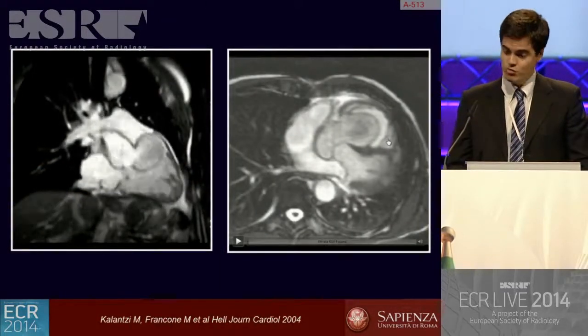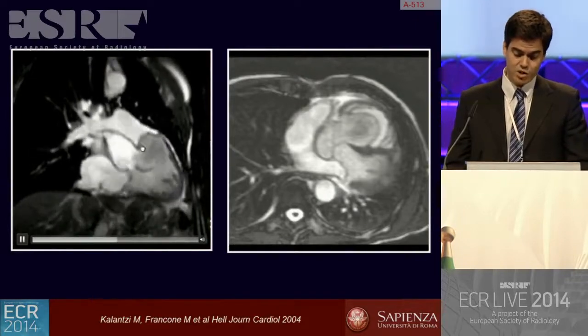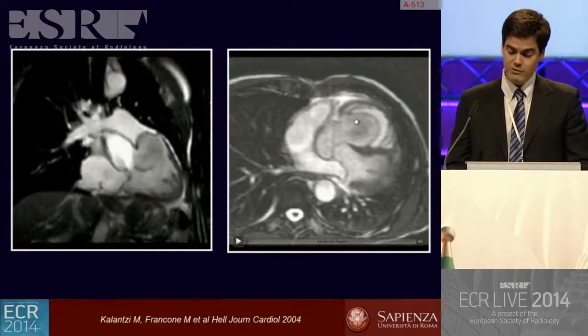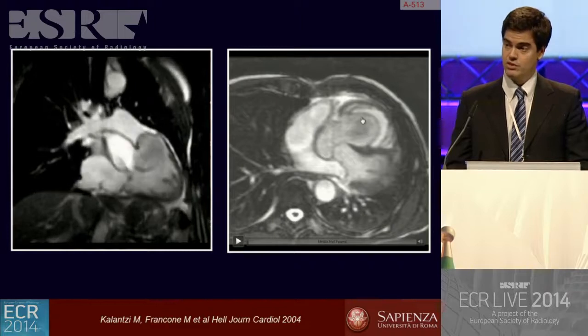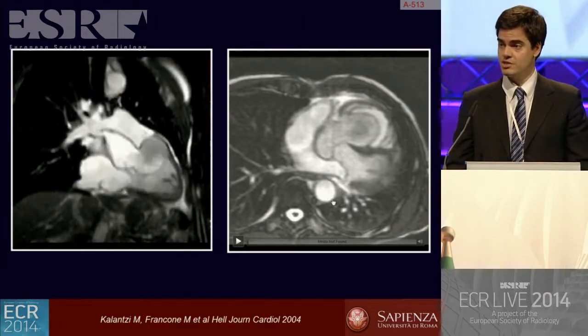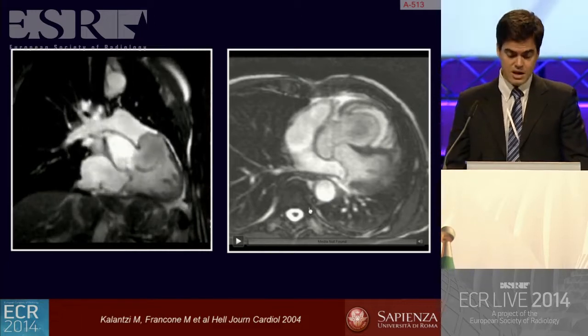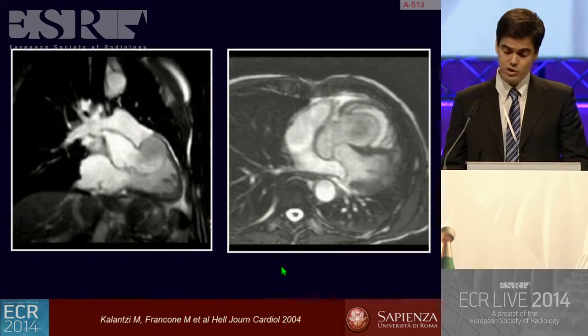And the first movie is not working here, but it's clearly already that you have a lesion which is communicating with the lumen of the aorta, and it is an aneurysmatic Valsalva sinus which is protruding within the lumen of the vessel. This is a typical case of a pseudomass which was clearly interpreted as a tumor, but I will show you how much things cannot be straightforward.